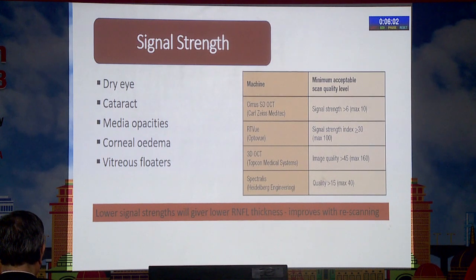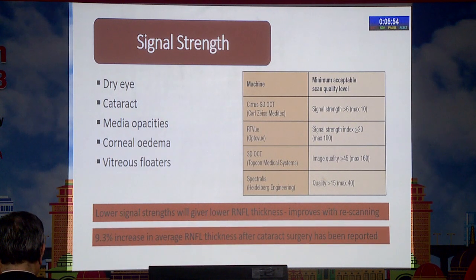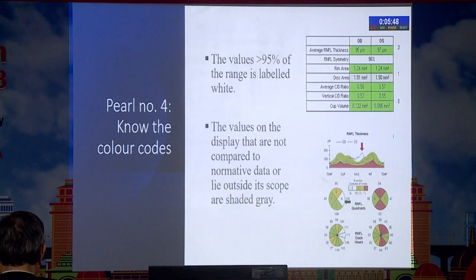Lower signal strengths give lower RNFL thickness. So a drop of lubricant not only improves the signal strength but also RNFL thickness. It has been reported that there is a 9% increase in average RNFL thickness after cataract surgery also.